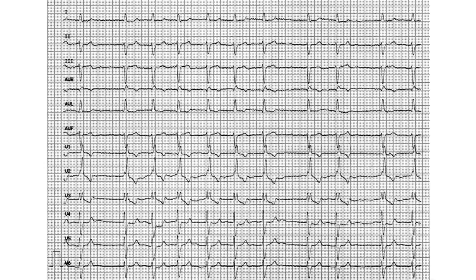So here we definitely notice something ain't right. There's this big pause over here in the beginning, and so that definitely ain't regular. That is definitely not regular at all as well, because the pause happens multiple times. So this is typical textbook irregularity. Okay, are there any extrasystoles? Well, you just go around here and you start to check.